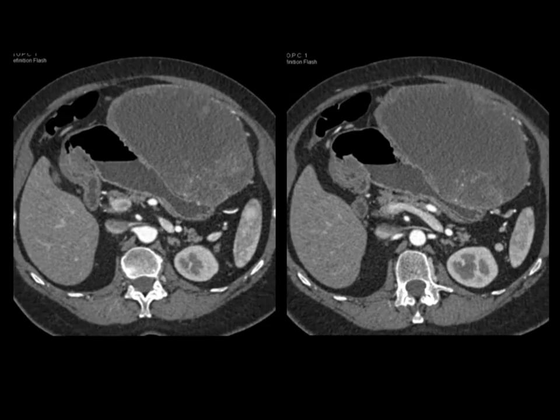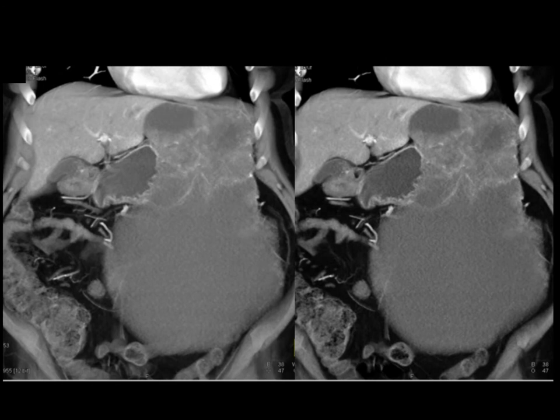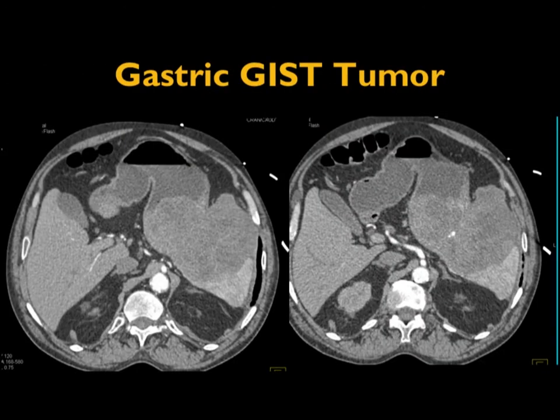It's interesting because they're so exophytic, there's no gastric outlet obstruction. You don't see ulceration, but tumors that are exophytic can grow intraluminally, and you will have both a large exophytic component with some intraluminal component. Here it is on the 3D map. You can see how exophytic this lesion is and how necrotic. Or in this example, large necrotic tumor, areas of calcification. Occasionally, GIST tumors can calcify.